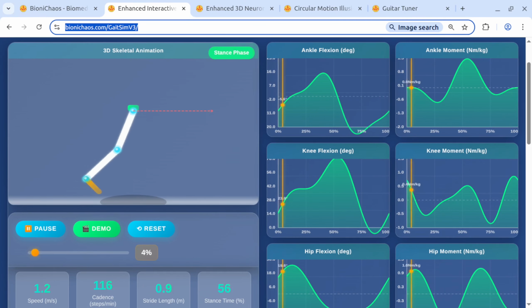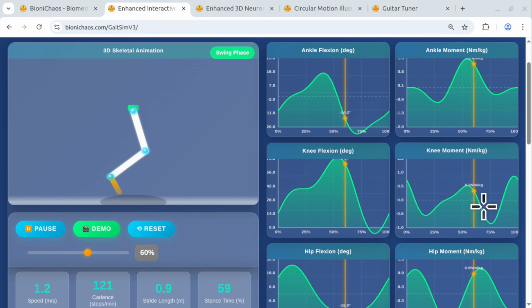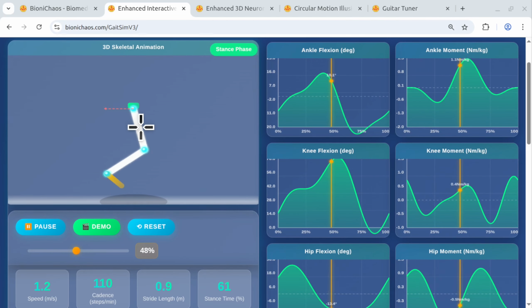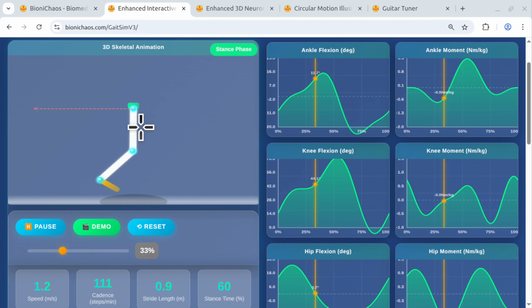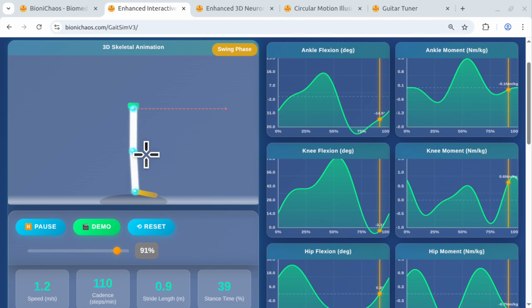For instance, a shadow or visual indication of pressure points beneath the foot during the stance phase would make it more realistic. This would address your observation that the ankle appears to be floating mid-air, as currently it's not clear where the ground plane is. The current visual is more of a kinematic representation, showing movement, but not necessarily accurate contact physics.